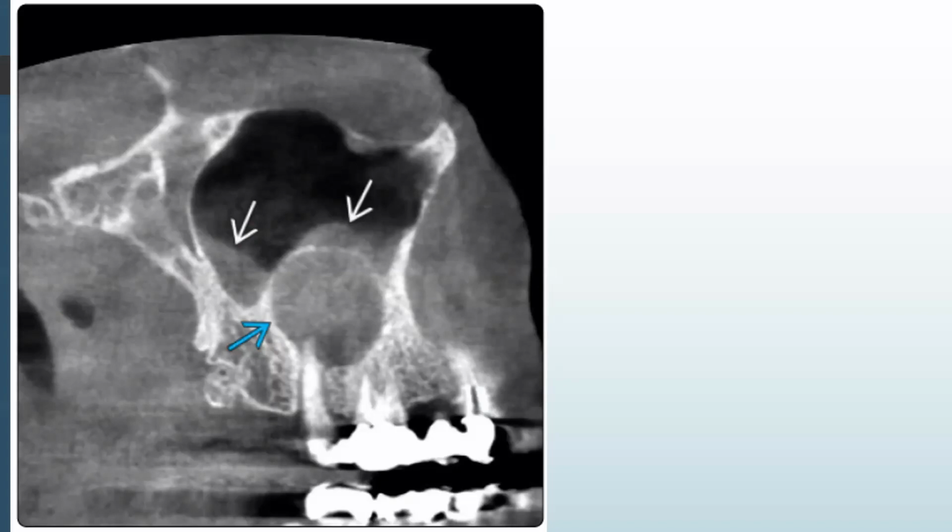Okay, and here also you can see a sagittal CBCT where the radicular cyst is present, and you can see that there is a floor of the sinus over here, and how the floor is lifted to this level. You can see very well the corticated margin, how the floor is lifted because of the inflammation of this lesion. And you can see there is a response of the inflammatory changes within the sinus as well.